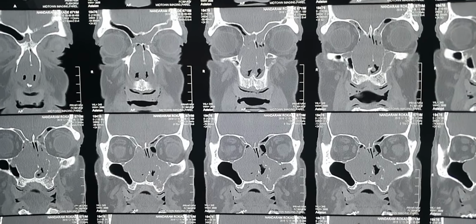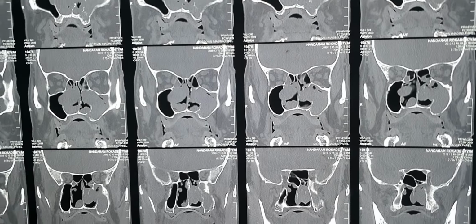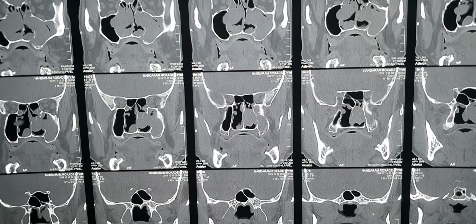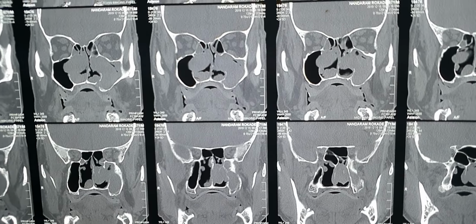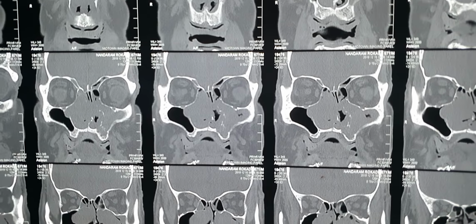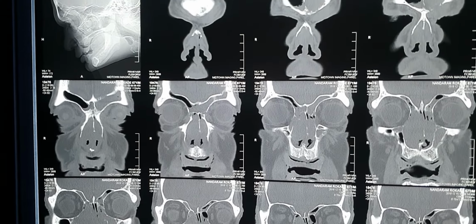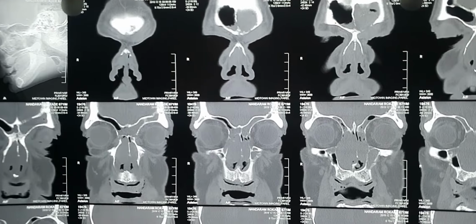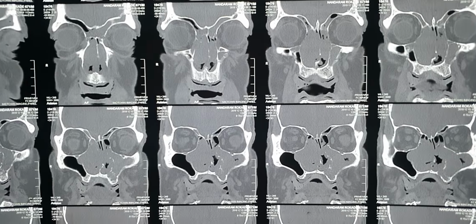Normally, if you find a case of extranodal Rosai-Dorfman disease, it is normally seen in patients ranging from the age of 15 to 20 years, which is kind of a young age. So it is very rare to find a case of Rosai-Dorfman disease in an elderly patient. So we were lucky enough to get the CT scan and the biopsy report for this patient.